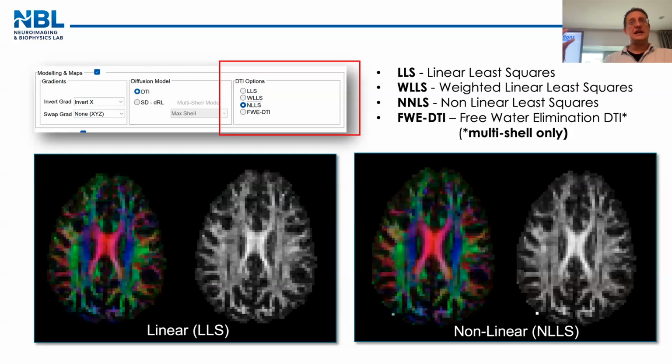So if you want to separate edema from the standard DTI, so it's kind of already microstructure modeling, the simplest one possible, it still gives you the standard DTI, but the DTI of the brain without the free water. So the mean diffusivity will basically not show any fast diffusion component. The mean diffusivity is normally 0.6, 0.7. With the free water removed, the mean diffusivity goes down to 0.3, 0.4. And you also have another map that gives you the volume fraction of free water. So if you want to quantify edema or water in the parenchyma, whatever, that could be a nice map to use.